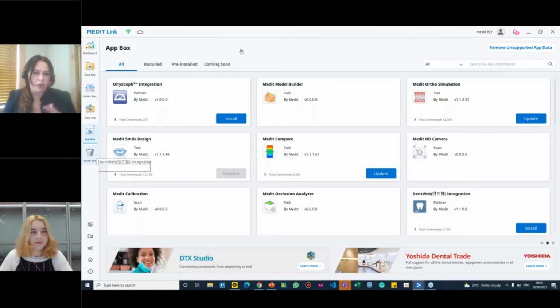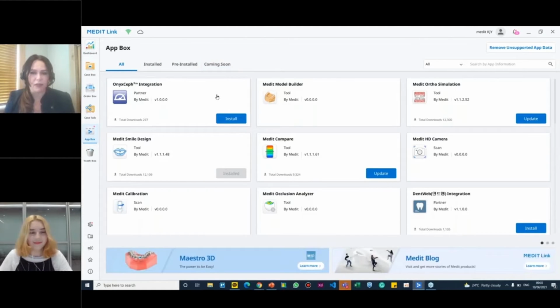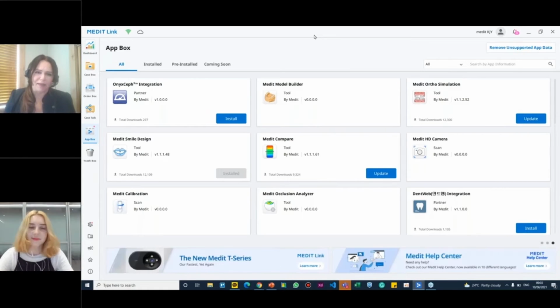As you can see, Maria is sharing her screen and she's going to walk you through where to find the apps and, from there on out, how to use them. So this is going to be a how-to webinar, not so much clinical information, but just how to apply these apps in your clinic.